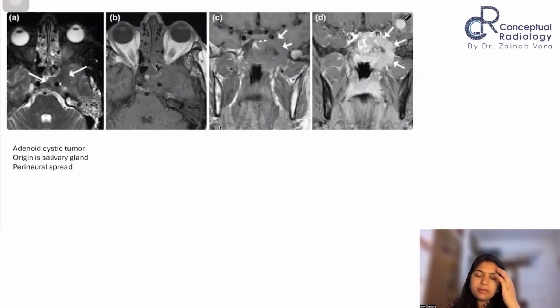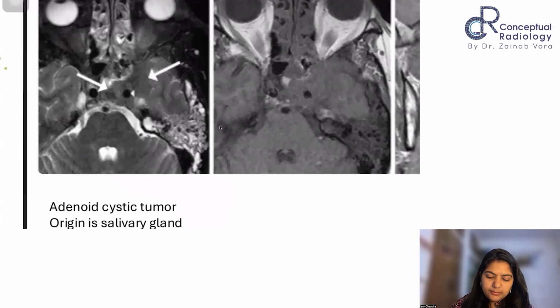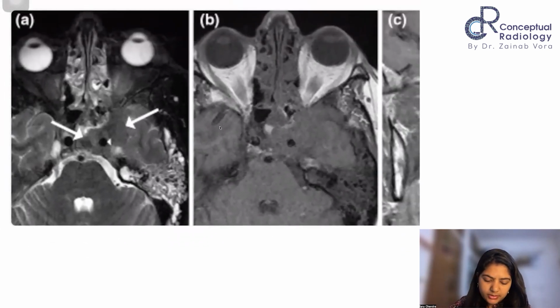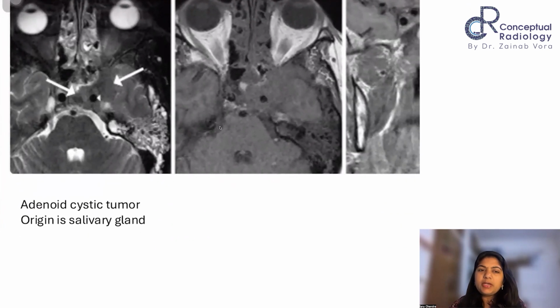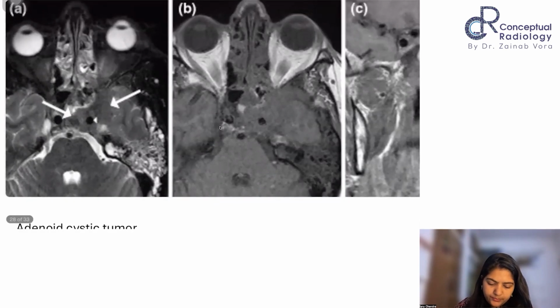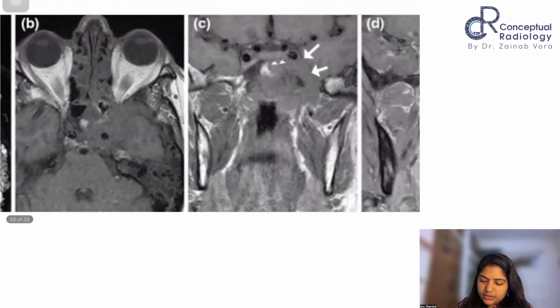I'm trying to keep some time for the case which I said I will show you. So for the masses, I'm showing images of these masses, right? Primary focus being on reading the images, okay? If you see here, now this is another case, okay? What is happening here? Let's try and see.